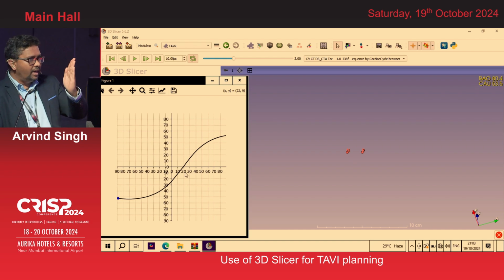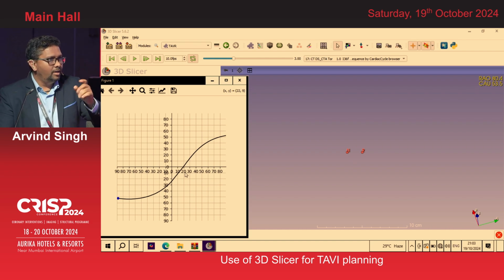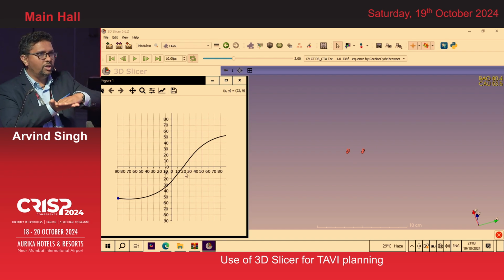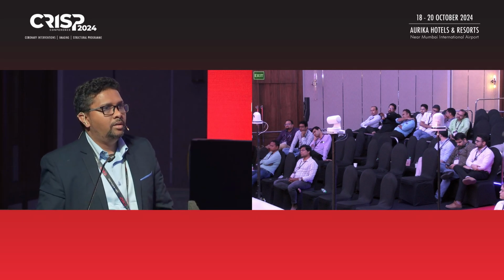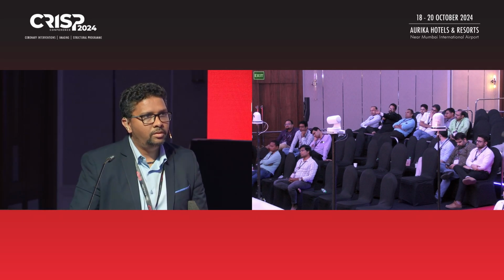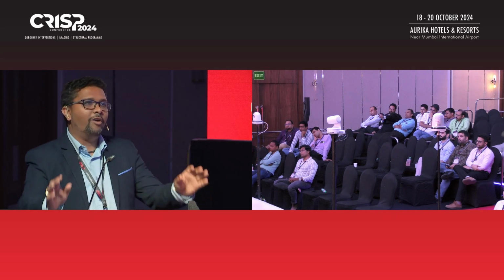So if it is a vertical S curve, the aorta is horizontal. The annulus is vertical, the aorta is horizontal. If the S curve is like this, the annulus is horizontal and the aorta is vertical. That is what we like. So in a horizontal aorta, the en-face view will be deep RAO without any cranial or caudal angulation. This is why I have made this software.